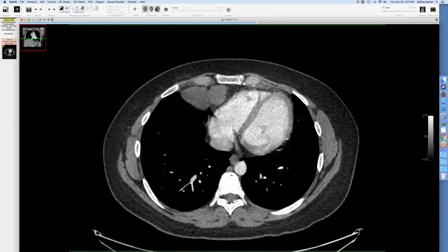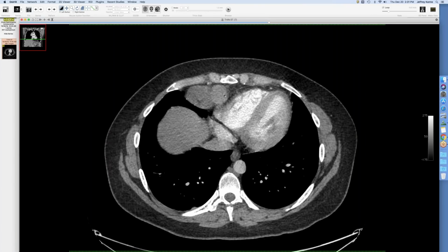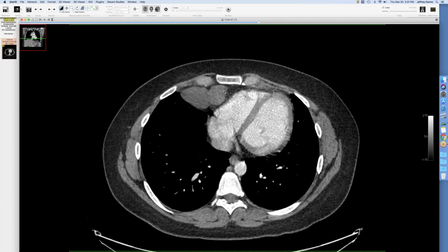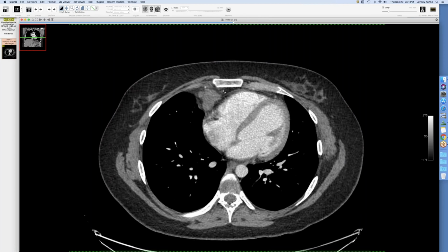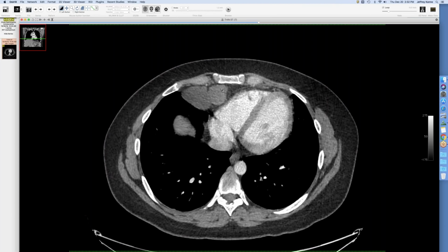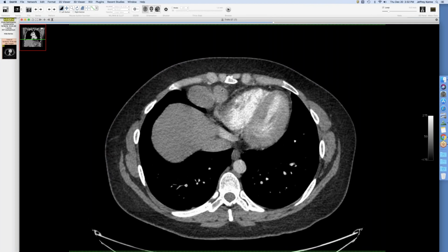At this age, we would think of maybe a germ cell tumor, maybe lymphoma. She's kind of on the young side for thymoma, doesn't have any myasthenia, but this is a solid mass. It's very homogeneous, so it doesn't quite look like anything. So you'd still have to, I think, consider a thymoma or maybe a sarcoma in this place.